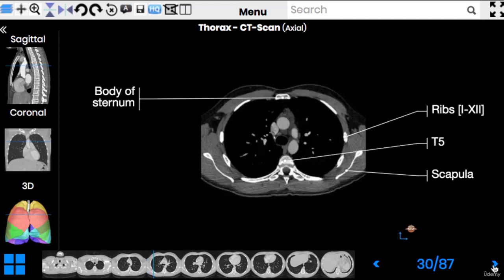At the level below we do not see any arches, but we have the ascending aorta in front and descending aorta behind. The ascending aorta leads us to the left ventricle, and the descending one is going to continue down to the abdominal cavity.